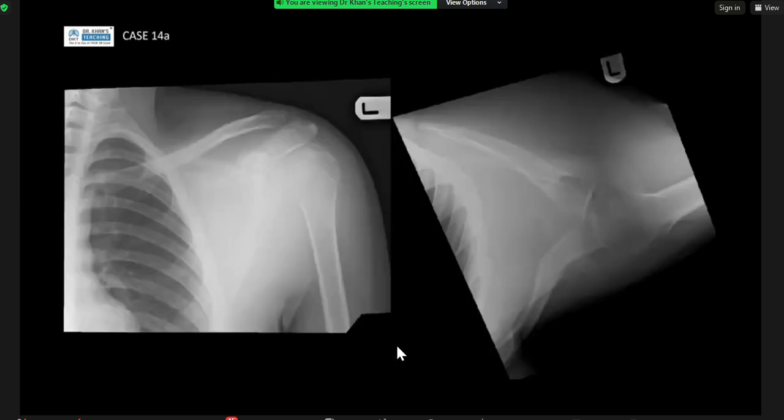Candidate 2. Yeah. Given the frontal and another projection of the left shoulder joint, I can see in the distal end of clavicle and humeral head shows. It's probably the axillary projection.